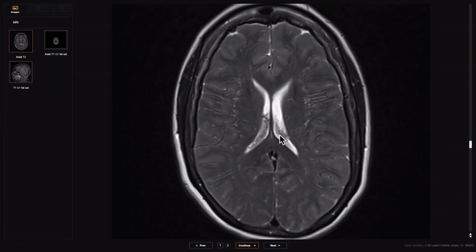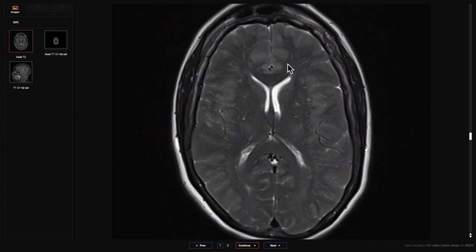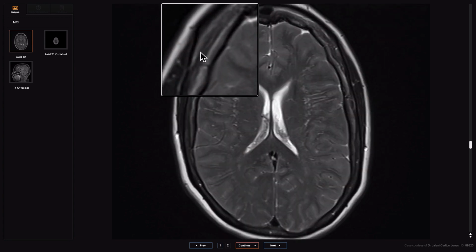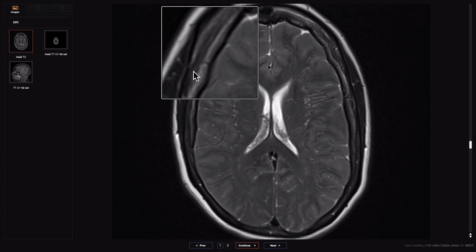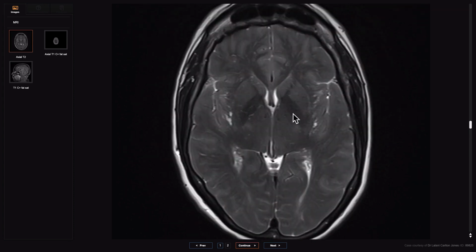Now here's an example of another case. This patient had a history of headaches for 4 years and was told her imaging was normal. So she was dismissed as having migraines, but actually her imaging is not normal. She was a young patient and her skull looks diffusely hyperostotic, and it looks abnormal in its composition also. Remember that layer cake finding we described, that inner layer of hyperostotic bone that sometimes we see in patients with chronic leak. She has that. And the more we look, the more we see.